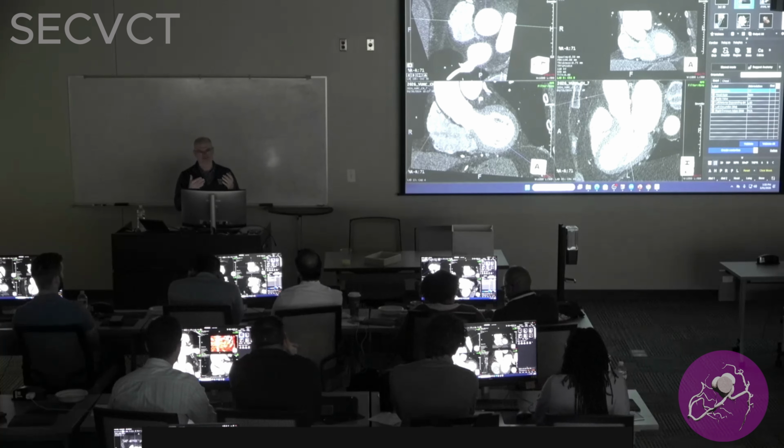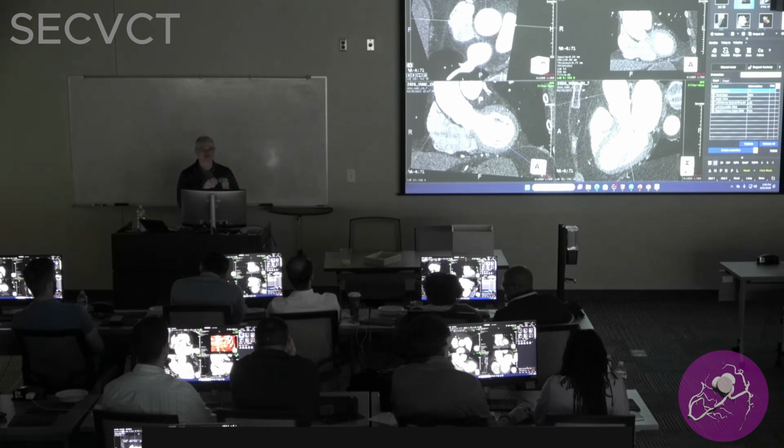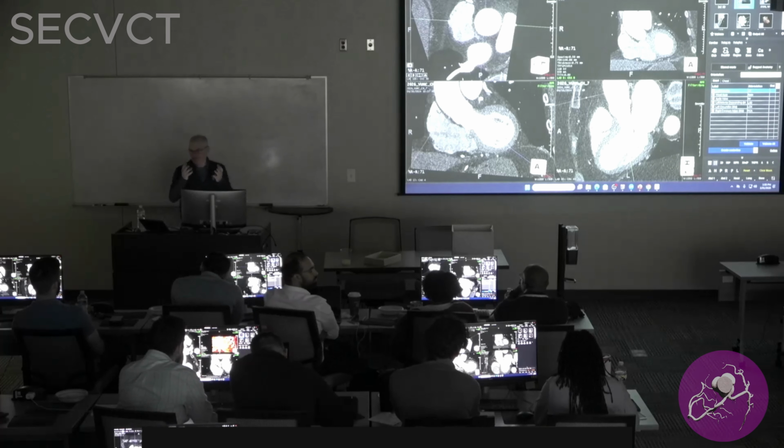If they're off, there's generally something odd going on with either the shape of the annulus, the way it was measured, motion artifact, a chunk of calcium, something that makes the perimeter and area be off by more than 2 millimeters or something like that. They should generally be within a millimeter, millimeter and a half or less. Sometimes they're right on, but they should be very close.